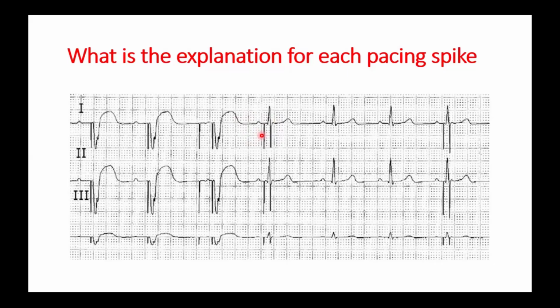So this is the difference in going down with the value of the sensitivity in order to make the atrial channel more sensitive. So you measure the P wave sensitivity in unipolar and in bipolar mode, and then you decide what to do in order to avoid this. Okay.